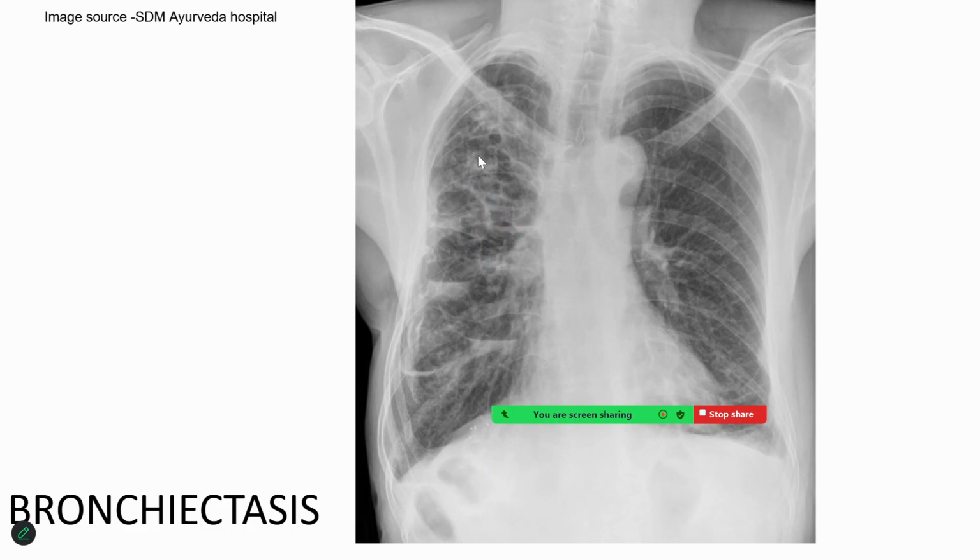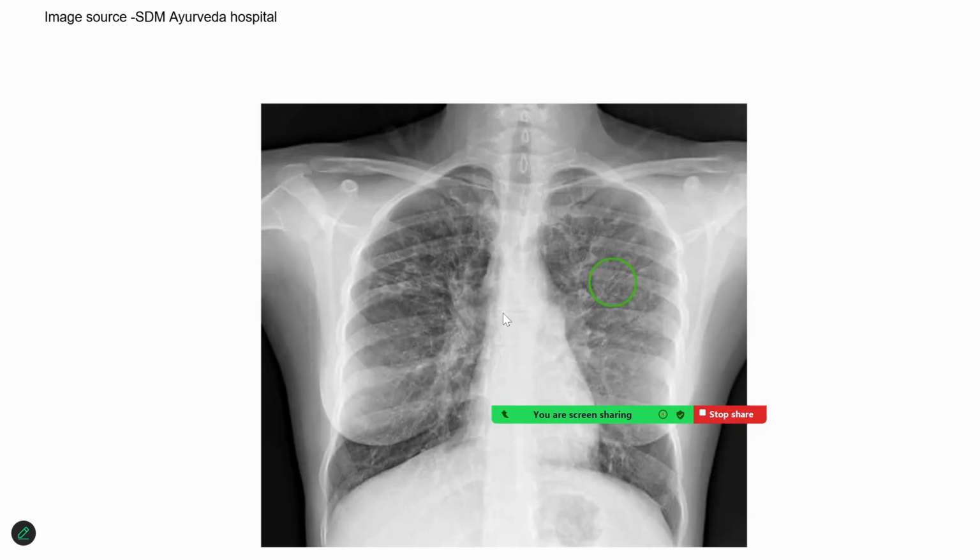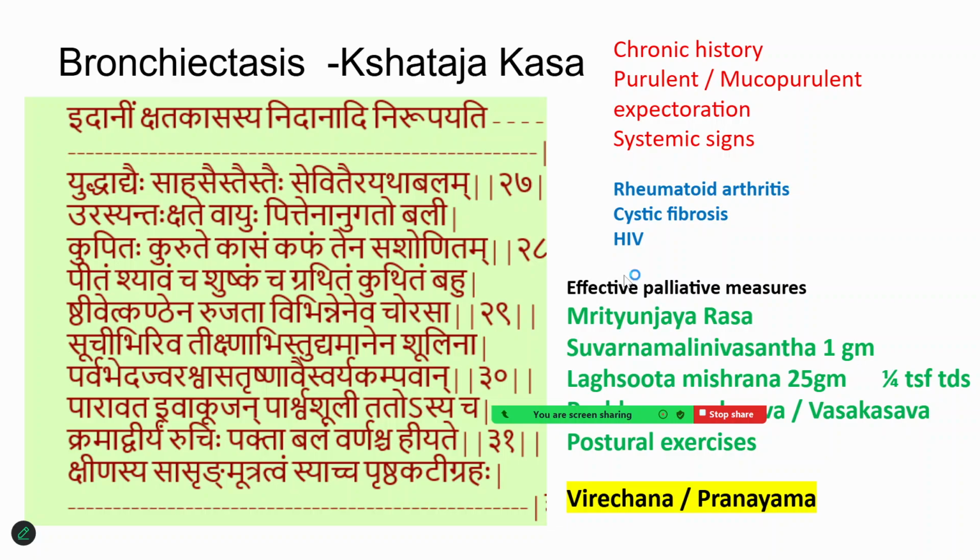There is a mixed pathology, but in this present situation, when we discuss bronchiectasis, we will focus on this area. These cavities, of course, I will be discussing later on. Thin-walled cavities are often suggestive of secondaries in the lungs. Anyway, in a typical bronchiectasis, where the lesion could be widespread, because of the thicker fluid and widened bronchi, you will hear coarse crepitations, which are mentioned as leathery rales, very loud rales as such.